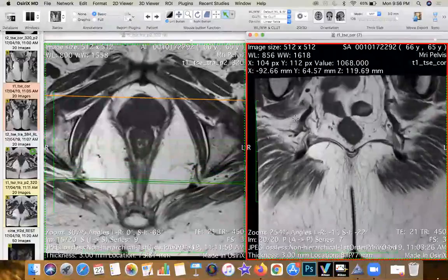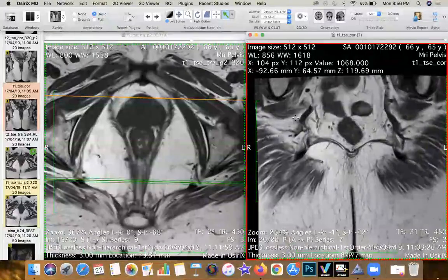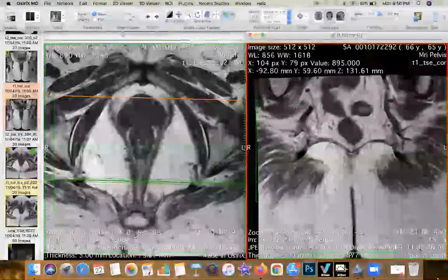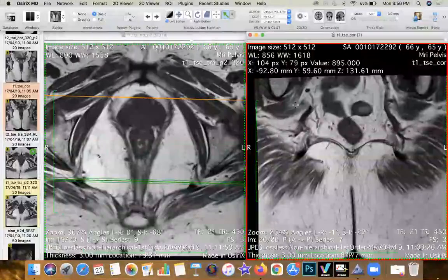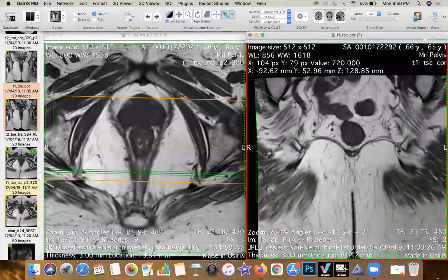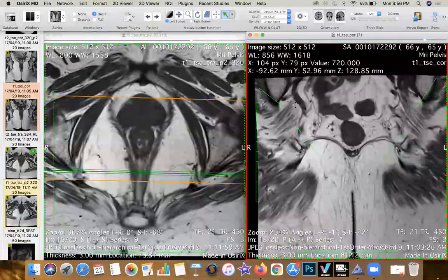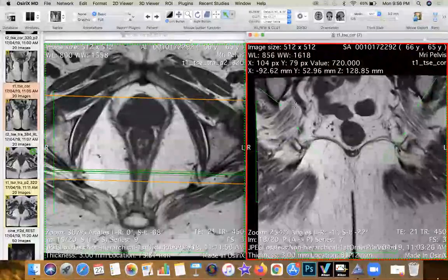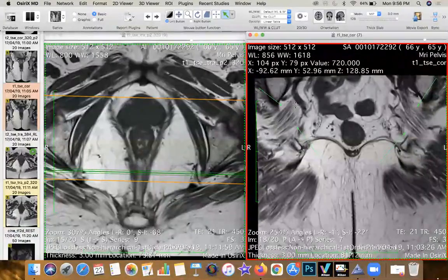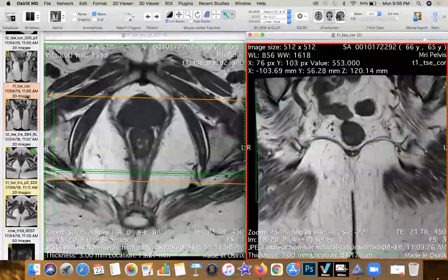So in all your patients who have pelvic floor abnormalities or certain kinds of issues, look at the piriformis muscle very keenly to see whether it's hypertrophied or atrophied. Is it symmetric or asymmetric? And see what is the impact of that muscle, because the muscle divides that notch into a superior compartment and an inferior compartment. Certain nerves go above into the superior compartment, certain nerves go below into the inferior compartment. So the lumbosacral plexus is very important to remember and identify.